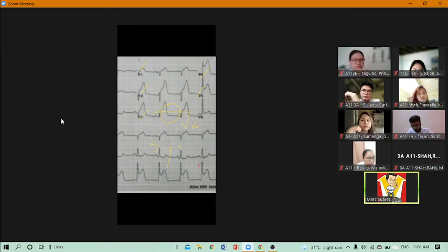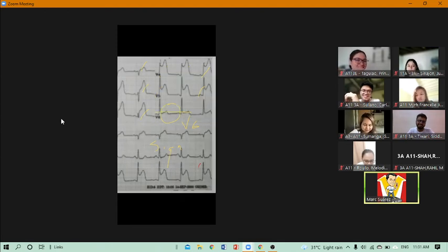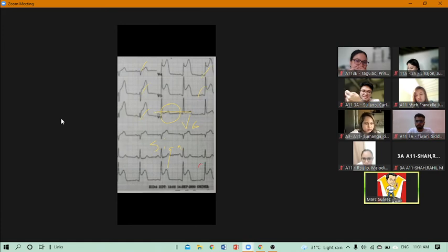My assignment now is this one. Oh, your assignment. I'm sorry, it's not my assignment, it's your assignment. We all know that in V6, there is an elevation of the J point. But what made us decide that this elevation is not significant, right? Let's look at it this way. What is the normal WBC count?